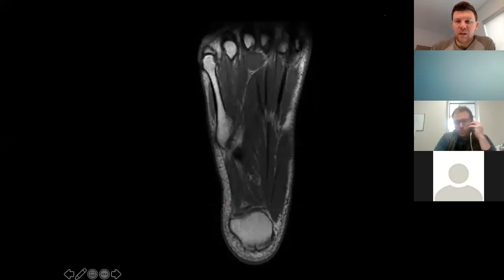So what we're seeing is, let me get my annotation back. It's an axial view, and where are we in the foot? Looks like we're plantar at the level of the met head. Okay. So when we're identifying here, which is the only full metatarsal we can see? The fifth. Okay, good.